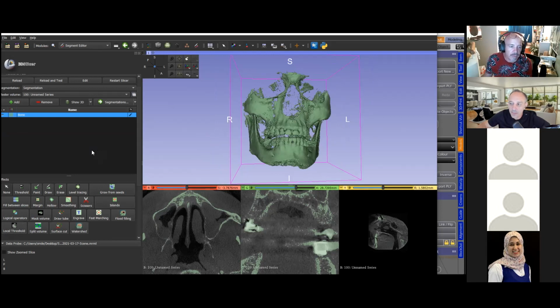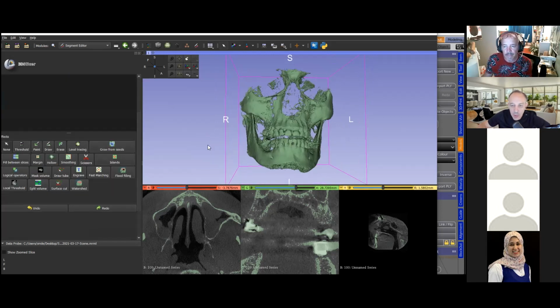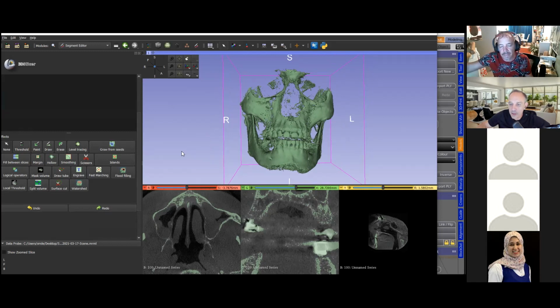So Michael, the sole purpose of making a small model which we're porting across to Blender is because we need to match the coordinates of the model to the coordinates of the CT scan. Is that right? Yes, that's right. Now, we'd like it to be small, but it is helpful to have a little bit of bone so that you can see where the implants are placed in Blender. So I'll show you exactly what I mean.